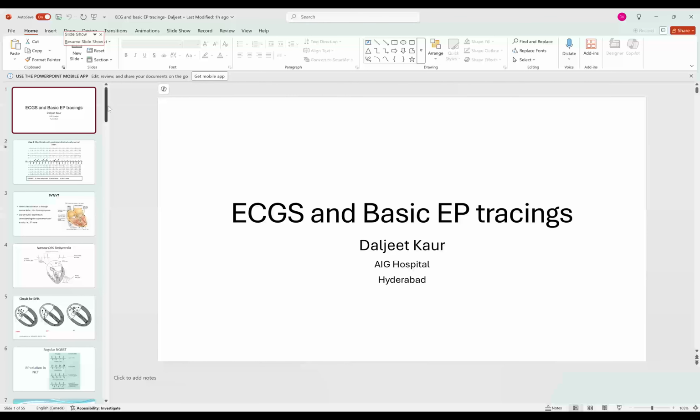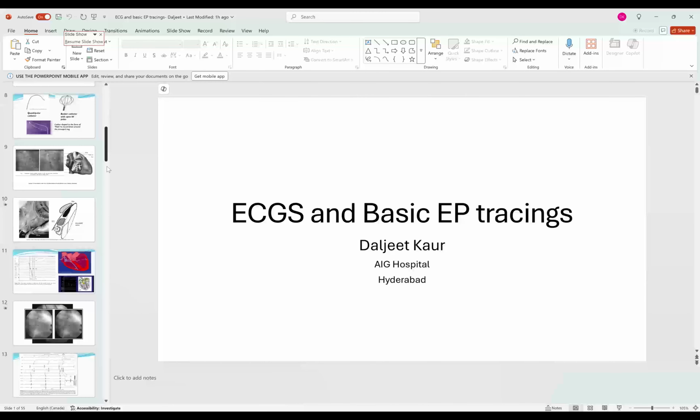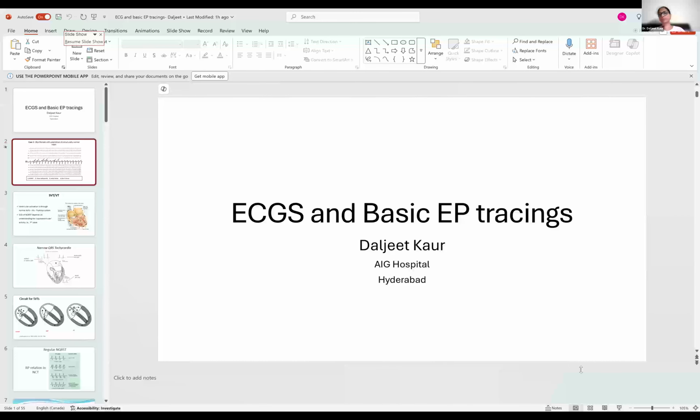Just a few points on the ECG. Perhaps we can focus on the ECGs a little bit more, to take our students from ECGs to the EP lab. So the first ECG that you showed and dissected out very well, can you just show that ECG again? Very first one, the AVNRT that you were discussing. This one, ma'am. Yeah.